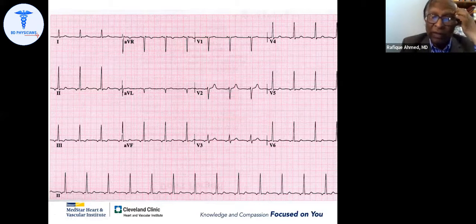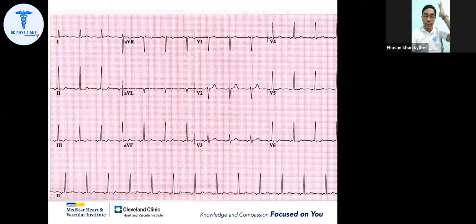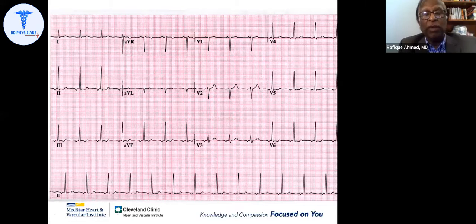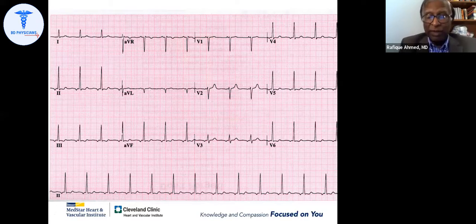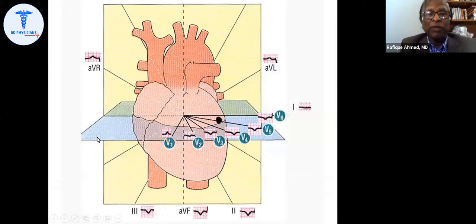So your diagnosis is left atrial rhythm, T wave changes, right? Yes, sir. Good, good. So now let's look at it. What I have done is I have actually taken these P waves and put them here. Look at what's happening, Murad.